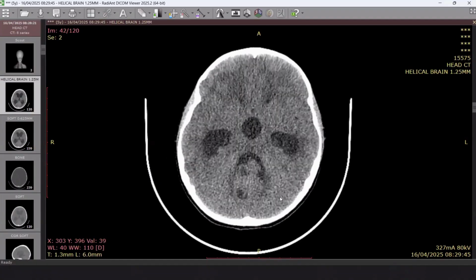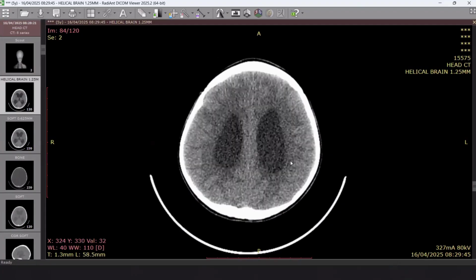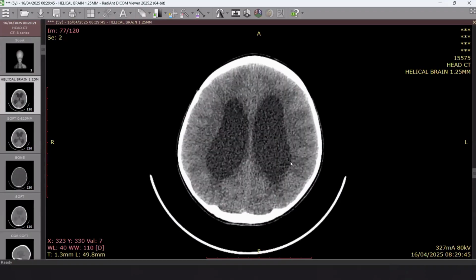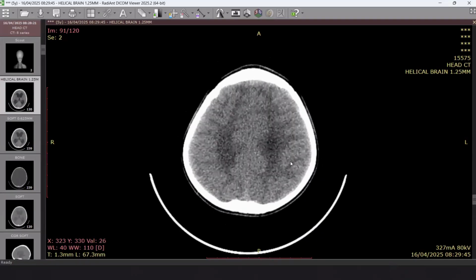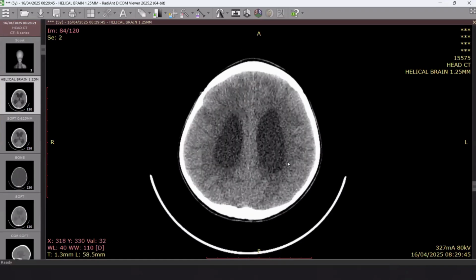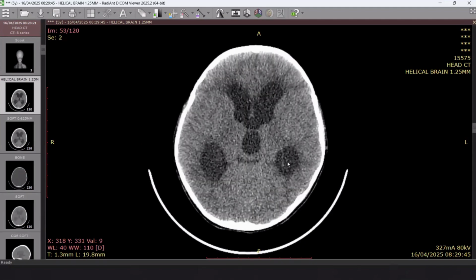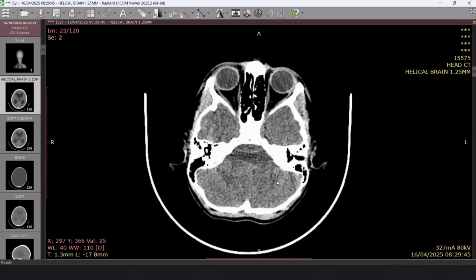We also see mild periventricular CSF leakage. I'm not sure if it is there or not, but some sort of subtle or mild. Maybe, but really it's not so obvious. But I think that we may have retrograde CSF permeation, but I'm not sure regarding this point. Let's focus more on this space occupying lesion.